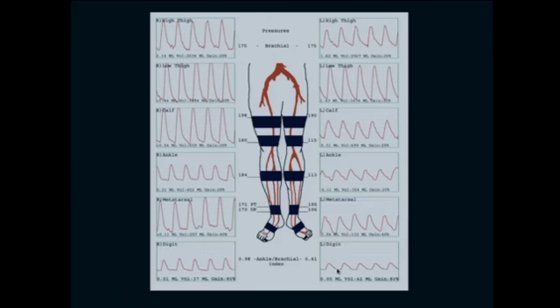Here is an example of one of our indirect tests. Here on this examination, you can see the ankle brachial indices are identified on the chart here. We also can see that there are segmental pressure measurements listed adjacent to the blood pressure cuffs along both lower extremities. And these measurements are then flanked by the pulse volume recordings that we see on both sides.